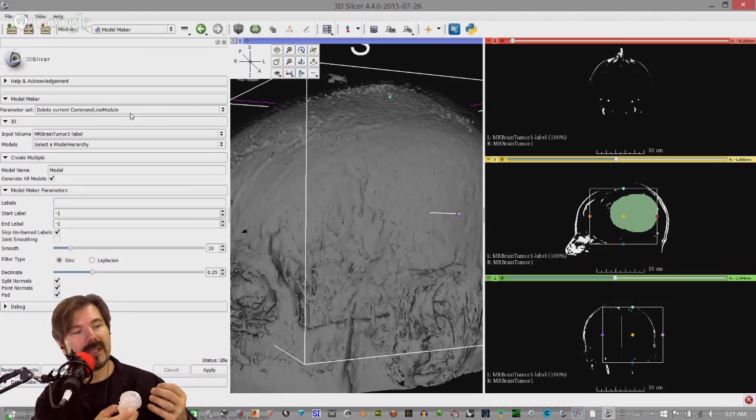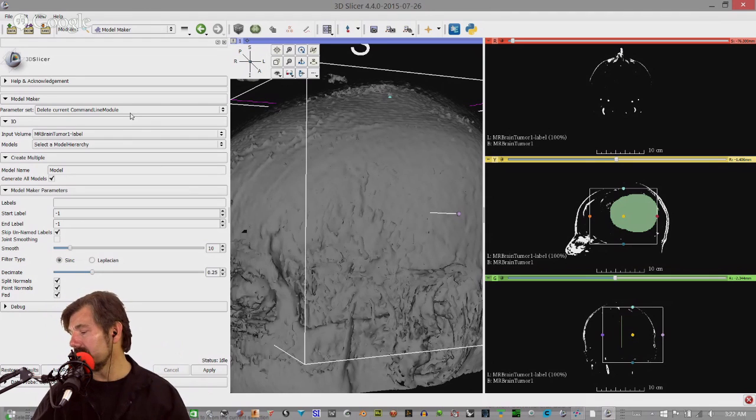And what do I mean by that? Imagine, let's say, a sphere, and a sphere is actually an infinite number of points in order to keep it spherical. But if you reduce those points, eventually you start to see faces on it, like a golf ball. So you need to create a balance of how many faces you need in order to create a good shape. And I find that a model like this really does well with anywhere between 1 million to 3 million. So if you are on the fence about getting a faster machine and want to do this, I would suggest getting it.